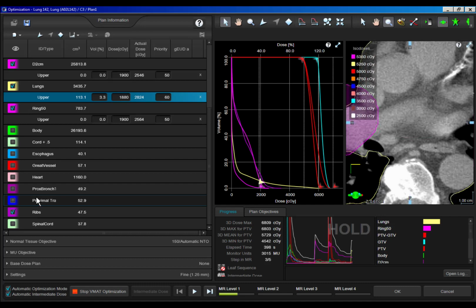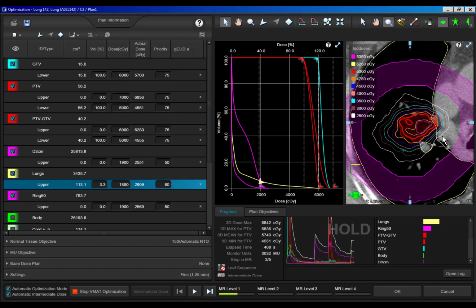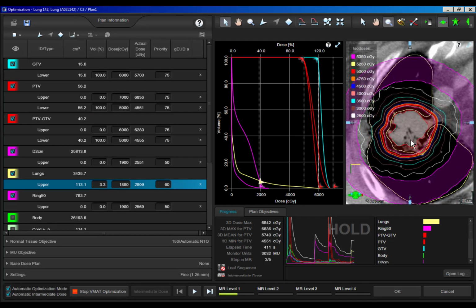So yeah, everything is pretty low. I don't think you guys are going to have to add any objectives as long as you add these ones and your plan shapes out properly. That's about all you'll have to do. And then I'll have you guys check to make sure you meet all your objectives with this spreadsheet, but otherwise it should be a simple week. Let me play this through and we'll go over that when it finishes.